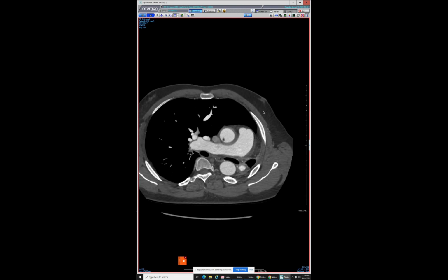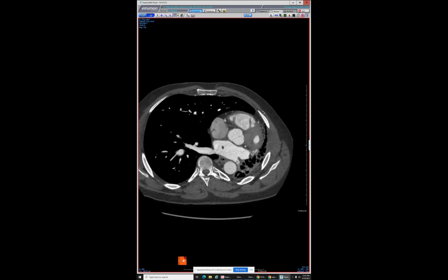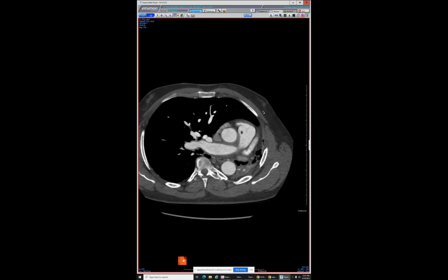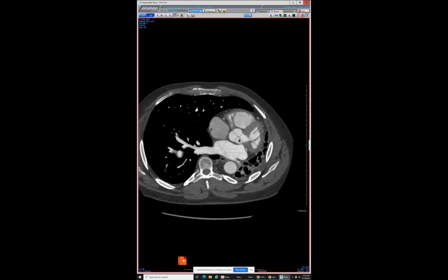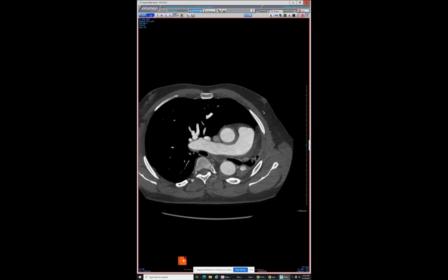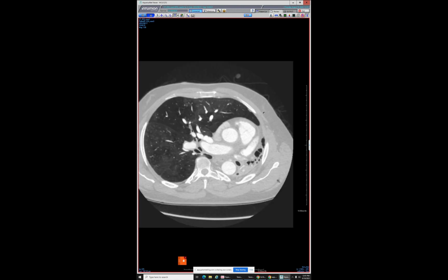So this is a patient with weird findings beyond the autopneumonectomy on the left. So the destroyed left PA, there is a pulmonary artery there. These don't look like bronchial collaterals, although there are pulmonary bronchial collaterals. There is a destroyed PA down there. The left lung is destroyed.